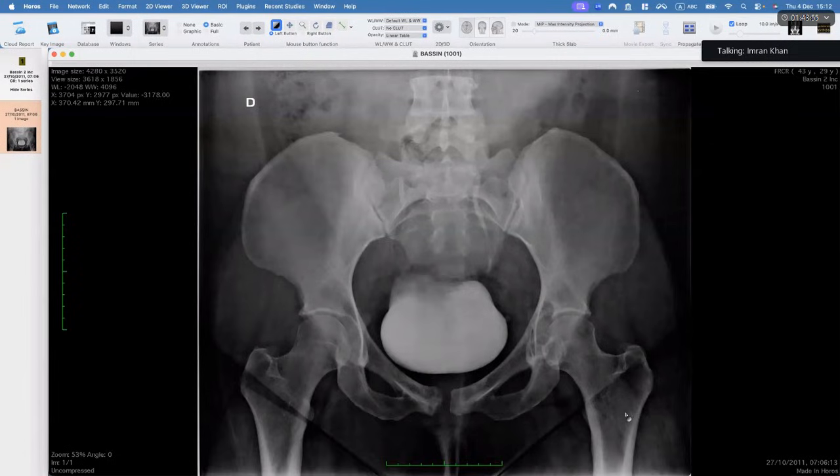Okay, all right. Let me take control. Okay, right hip, right femoral head. Any abnormality? Any bone density changes? Anything going on there? The acetabulum margins are very subjectively sclerotic. Which side? Right side is normal. Then the left side is also okay.